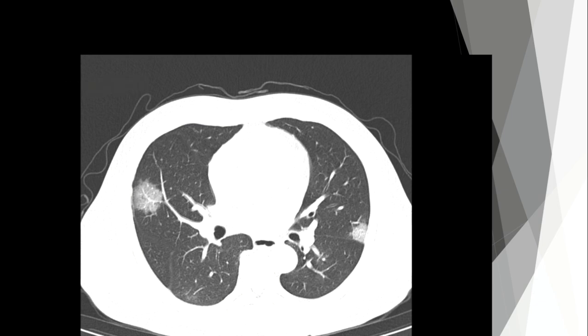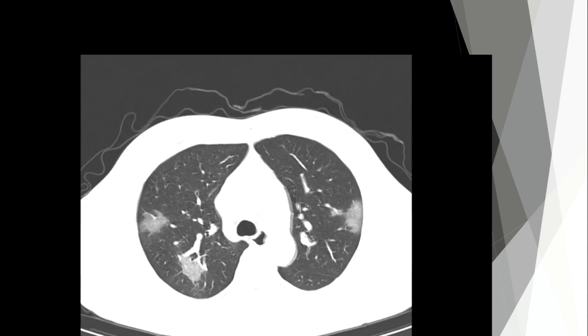So let's review what we just said. So bilateral in both lungs, ground glass. So this is an example here of a rounded ground glass opacity. So ground glass just means an opacity that does not obscure the underlying vessels. So you can see the vessels through this opacity. This is a ground glass opacity. And as I mentioned, in COVID-19, they've often been observed to be rounded. So if I scroll through this case here, we have bilateral rounded ground glass opacities.